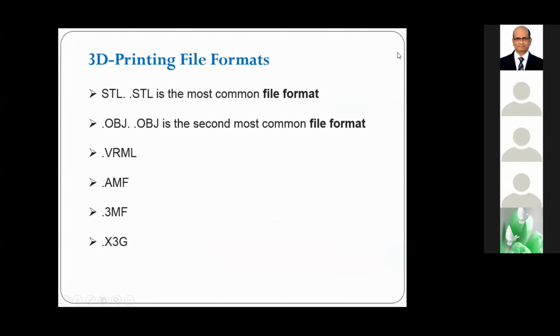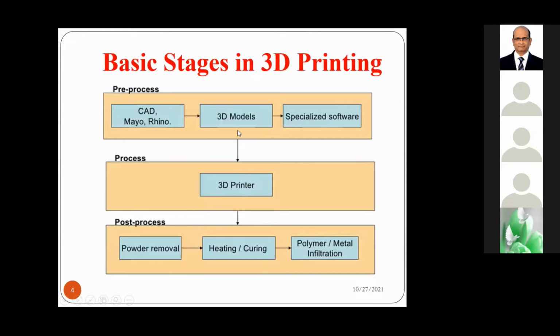So now you can see here, in this 3D printing process, I'm dividing it into pre-processor, processor, and post-processor. Here in the pre-processor, we require all the software. Using all the software, we are going to develop the data. Then in the processing, we are going to manufacture a component. In the post-processing, we handle whatever support structures and post-processing techniques there are.